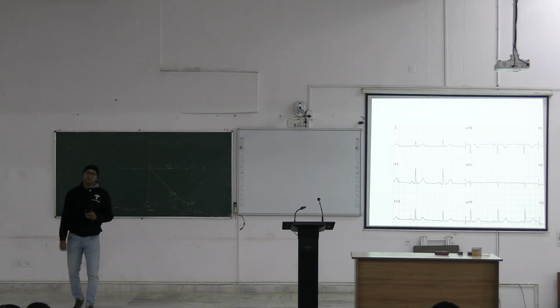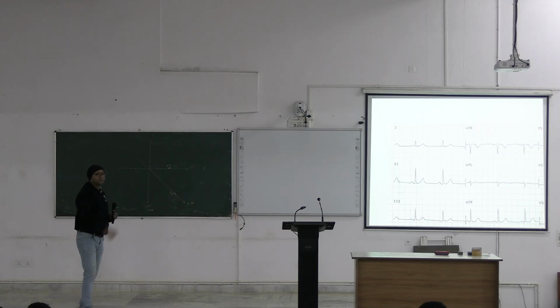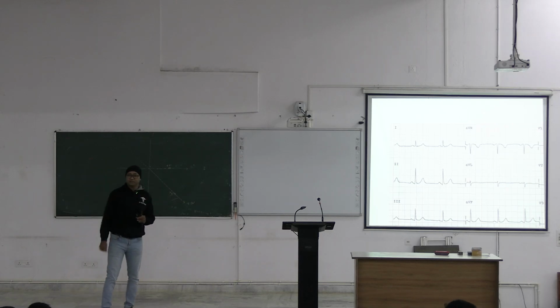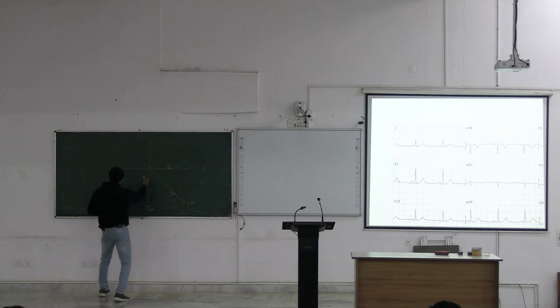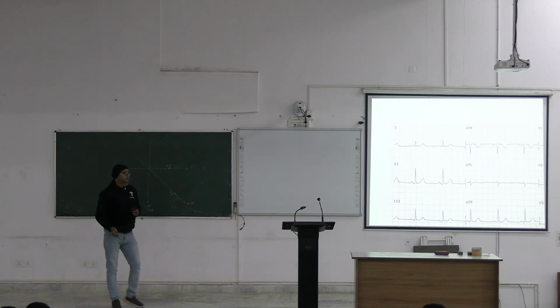Okay. If this were negative, meaning lead 2 is now positive in this ECG, in this example, lead 2 is predominantly positive, but had it been the case that lead 2 is predominantly negative, then you need to mark it in this direction. Clear?